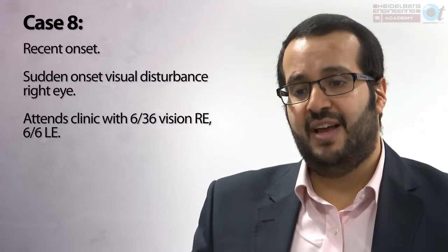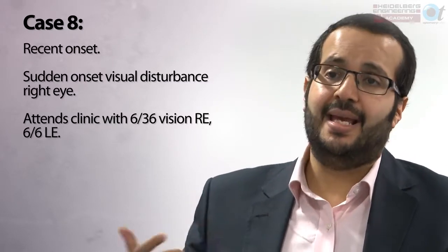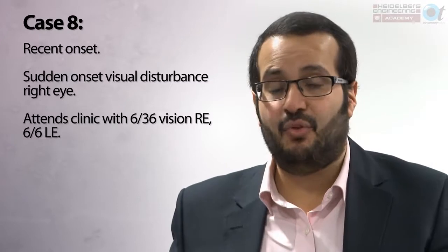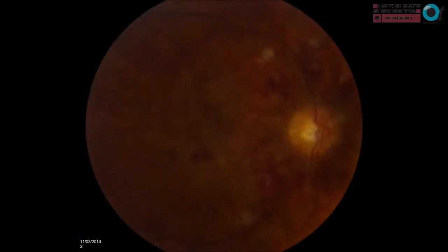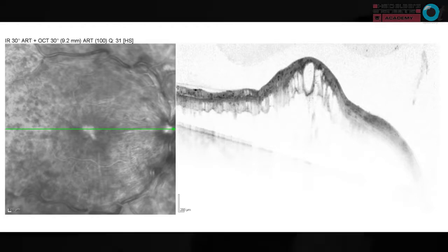Another case of vein occlusion. This patient noticed sudden onset of visual disturbance in the right eye. He attends my clinic with vision of 6/36 on the right, 6/6 on the left. Here you have again a good going central retinal vein occlusion with macular edema, with widespread hemorrhages affecting all four quadrants of the retina, with gross macular edema on OCT. This patient needs to be referred to hospital.